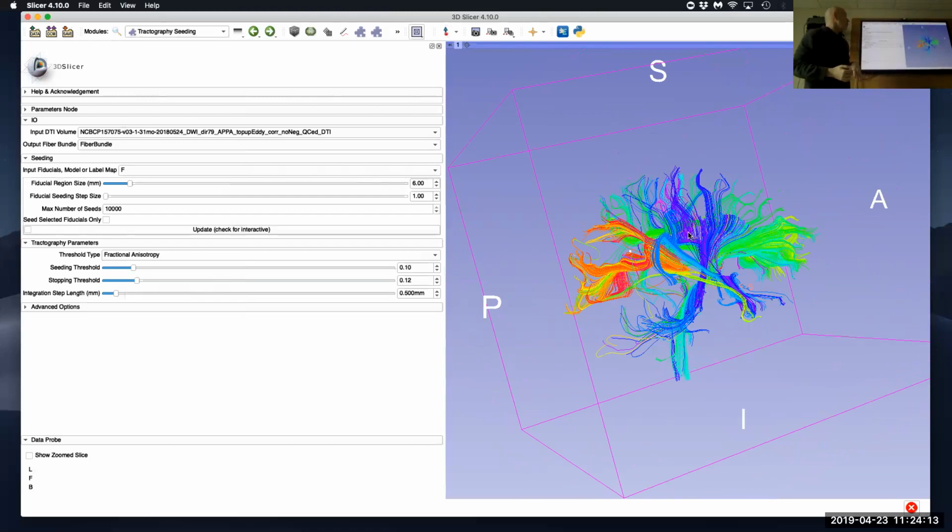And depending on how big the issue is, rather than the drift, you would see that all of them are just early terminating. That's another possibility. But basically, all the tracks you get are pretty short. And that's very much indicative of a problem with the scan, and with the scanner actually, not necessarily just with the scanner.